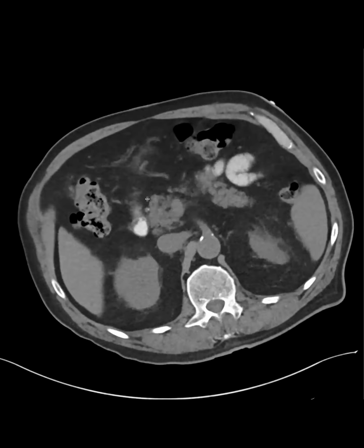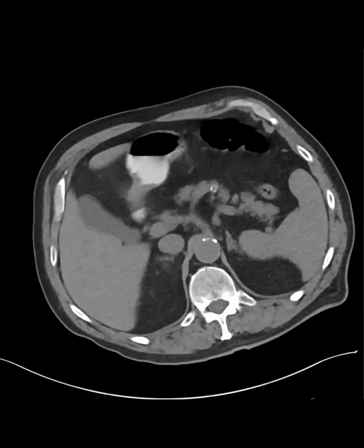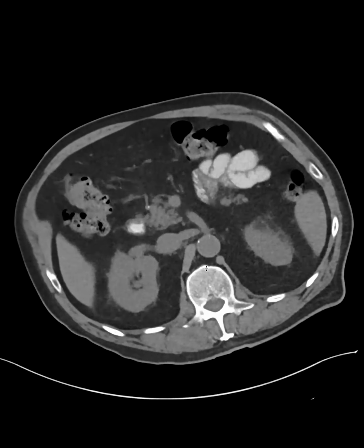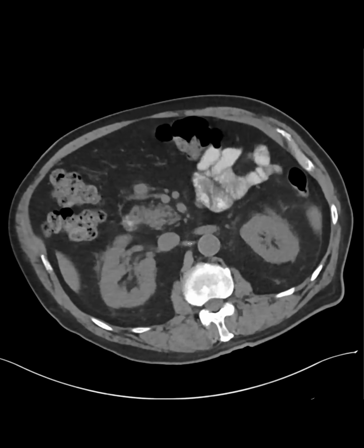Yes, like so I see the pylorus, antrum. Yeah, pylorus antrum. They're just thickening. I think it might be thickening. Okay. There are some ugly nodes though around the D1, D2. Yes. This chunky one, right? And then is there a pancreatic head mass?